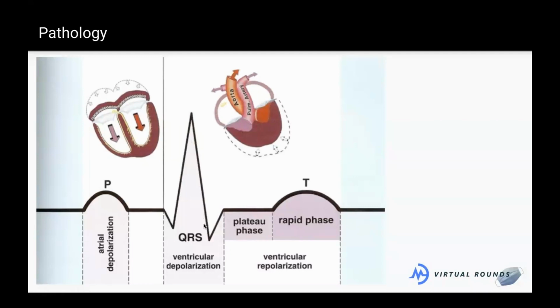The reason that we're seeing the waves go up and down is, again, because if we're an EKG, we're a camera down here at the left foot, looking up at the heart from the foot. As I'm seeing these waves come down towards me from the top of the atria, I'm going to see those vectors be positive as they're coming up towards me.